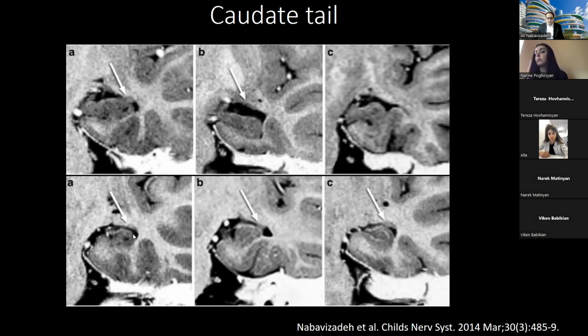And again, in some patients, it's nodular but protrudes into the brain parenchyma, and in some, it's in between. So the long story short, there is significant variation in caudate tail imaging appearance when it comes to the temporal part, where it is adjacent to the temporal horn.